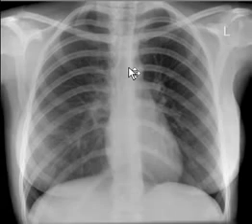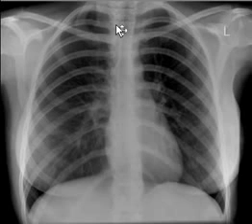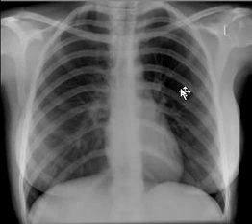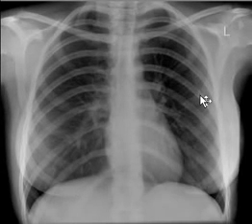As you can see, the medial end of the right clavicle, which is visible here, is projecting over the thoracic spine, versus the medial end of the left clavicle here is projected away from the thoracic spine. This patient is slightly rotated towards the left-hand side, and if the patient is rotated either on the left side or right side, you may see asymmetry of grayscales.